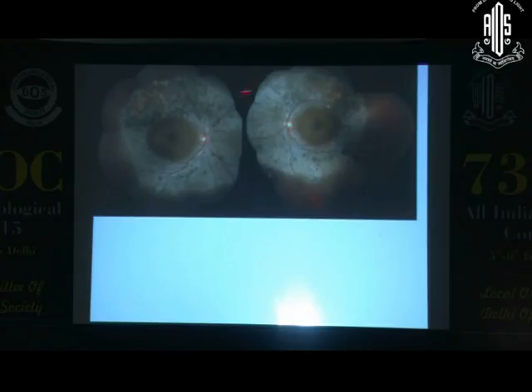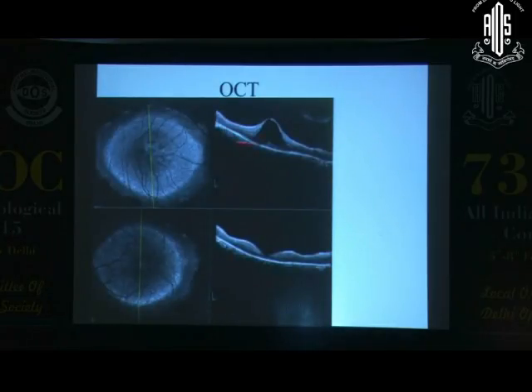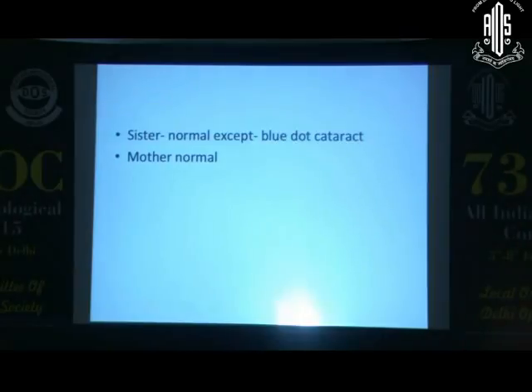So you have these characteristic changes in a patient with enhanced S-cone syndrome. You see these nummular changes all around. You are looking at a patient without a doubt with enhanced S-cone syndrome. There's an autofluorescence that lights up so well on a FAF. And it is very common for these patients to have a lot of CME. It's extremely common, and they don't respond very well to the routine agents that we see.